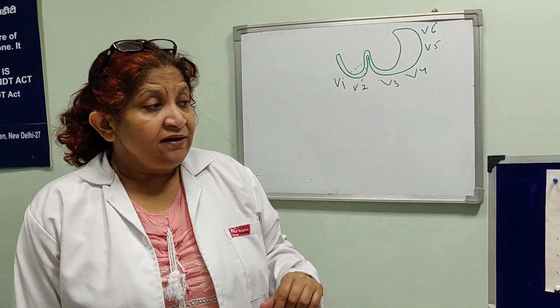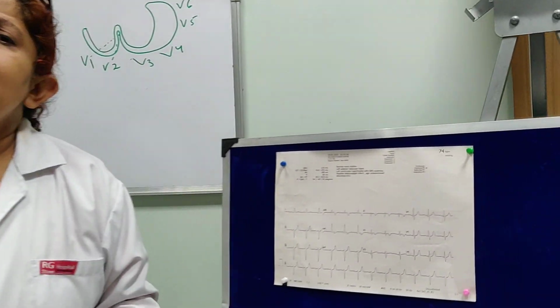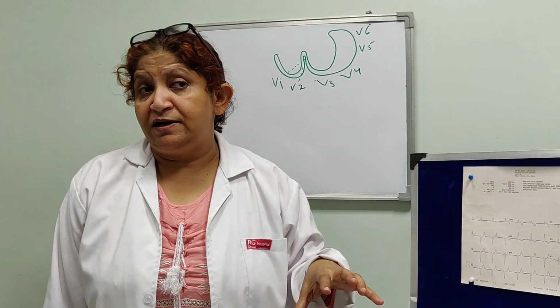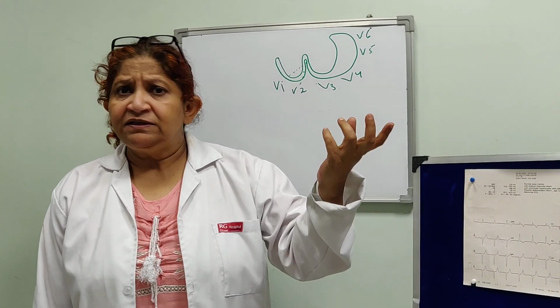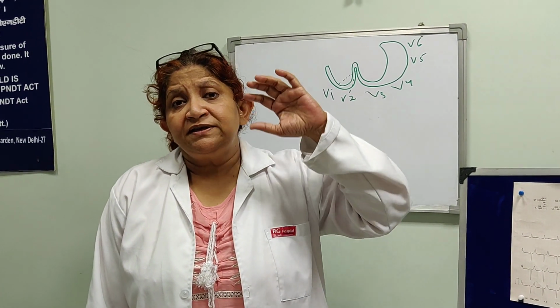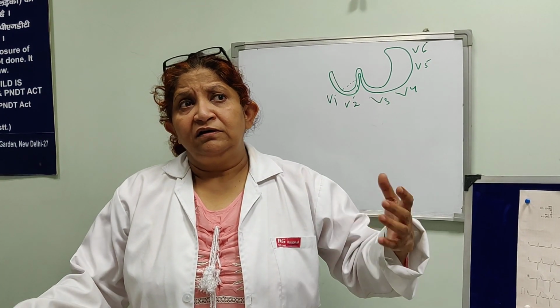Alright. Then what is remaining is AVR. AVR is one limb lead which actually looks only into the cavity of the heart and maybe some part of the right ventricle directly. But since all the complexes are negative in it, it is not very interpretative in the sense of picking up a myocardial infarction.